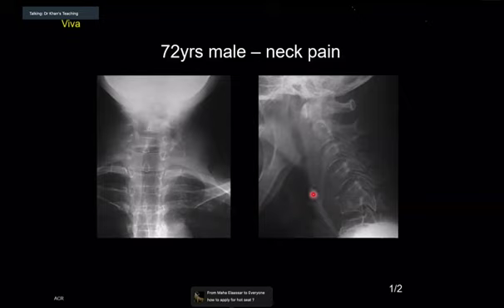For the soft tissue anterior to the lower cervical spine, those of you who are ST1s, if you open a textbook, it will give you measurements. But one formula is to just eyeball it: anything more than the depth of the vertebral body is abnormal. So there is a lot of soft tissue, which means there must be an abscess.